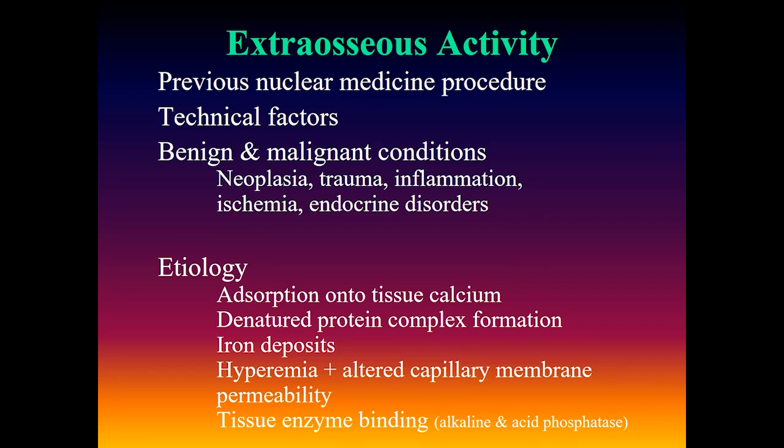Extraosseous activity can be seen from time to time on bone scans. Probably the most common cause is a previous nuclear medicine procedure, and whenever you see this extraosseous activity, that's the first thing to be questioned. Has this patient recently had another nuclear medicine procedure?